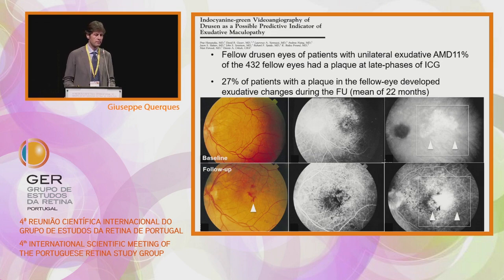You know that sometimes it is difficult to detect some minimal exudation even on a stereo fundus examination or fundus photograph, as well as minimal leakage on FA. So based simply on fundus examination and FA, this group decided to state that this neovascularization, well visible on ICG, was not exudative.